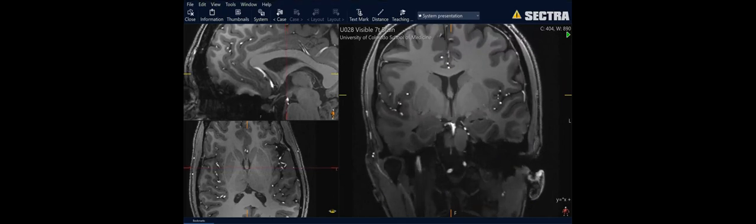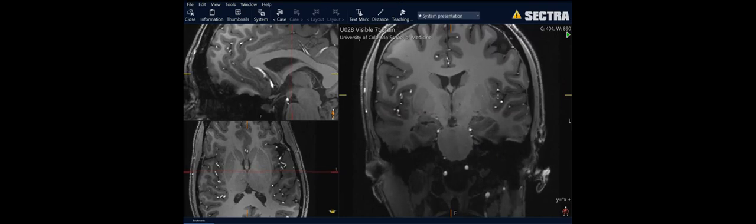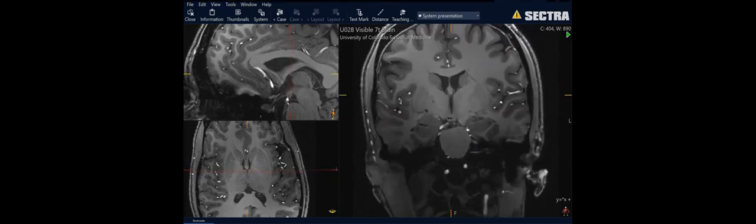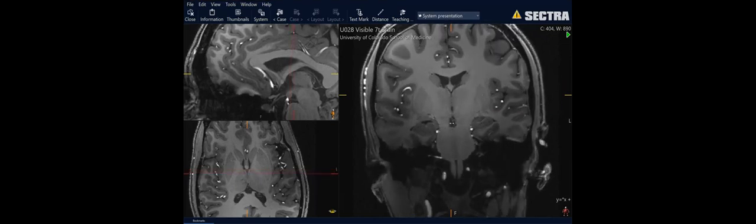Okay, so we've got the insular cortex, the lateral sulcus, and this frontal or parietal operculum, and the temporal operculum. They're little lids. All right, proceeding posteriorly. So we've got those mammillary bodies just here, and then they give rise to the interpeduncular fossa. So now we're looking at the cerebral peduncles and the thalamus.